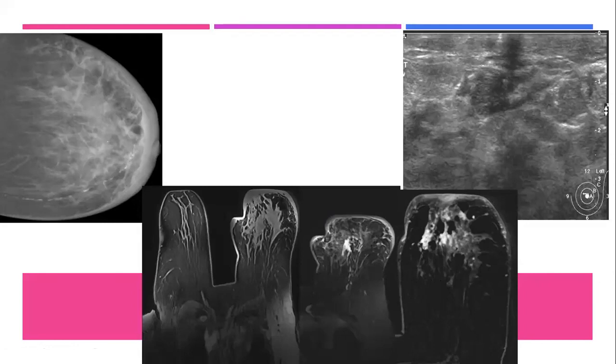So the findings are suspicious, and also the lesion is seen extending toward the nipple, which is thickened and enhanced. And that is invasive.